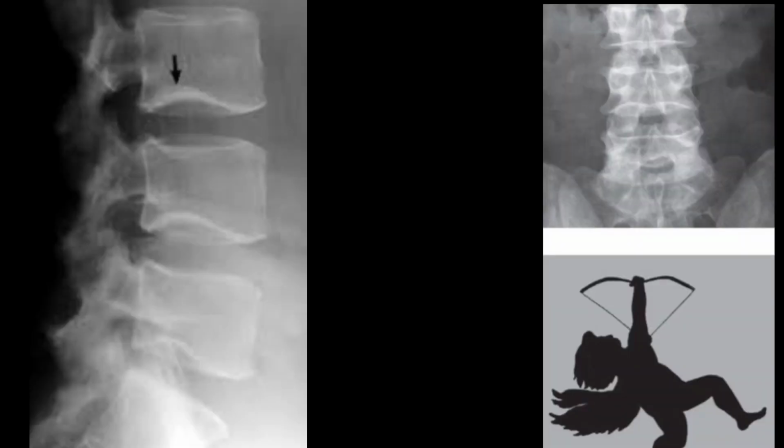Vertebral end plate abnormalities, representing certain abnormalities, may be of local type, or most of the time systemic abnormalities, and can be predicted on the vertebral end plates. The most important one is Cupid's bow vertebra. Here on this image you can appreciate the Cupid's bow vertebra. As far as its cause is concerned, it can be considered a normal variant, and the 3rd to 5th lumbar vertebrae would be involved.